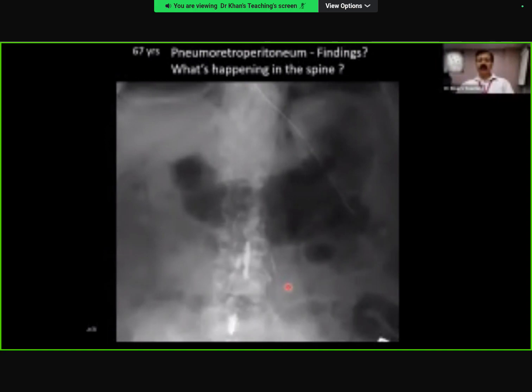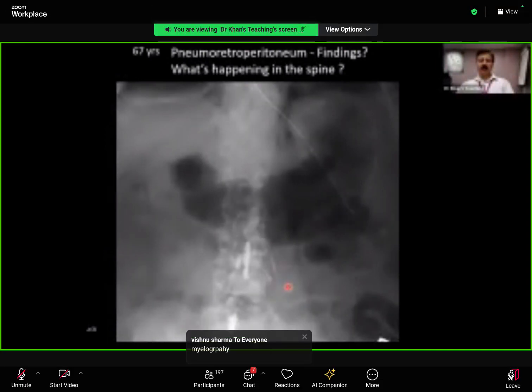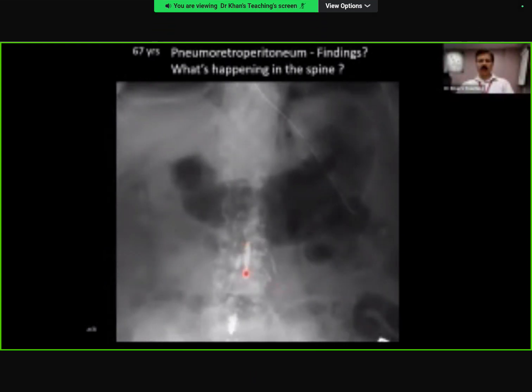In that era, we used to do myelograms with a contrast agent which was known as Myodil, and it could stay there forever like this, and there was a lot of toxicity, etc. Please remember that these patients are still around; they are still alive. And if you see it, it's got an Aunt Minnie type of appearance. Nothing else can give you this kind of appearance.